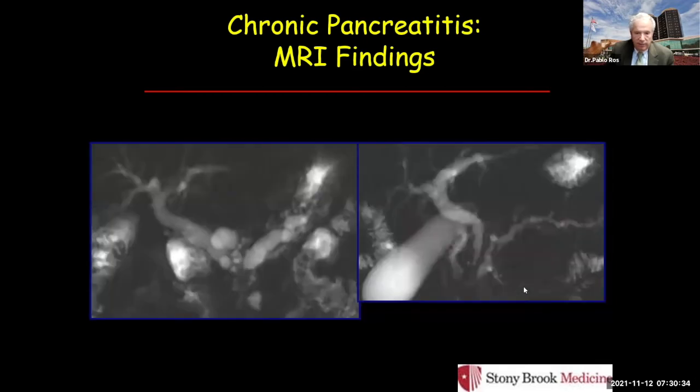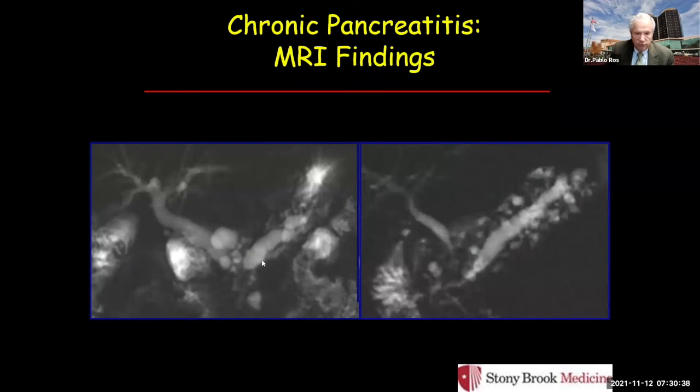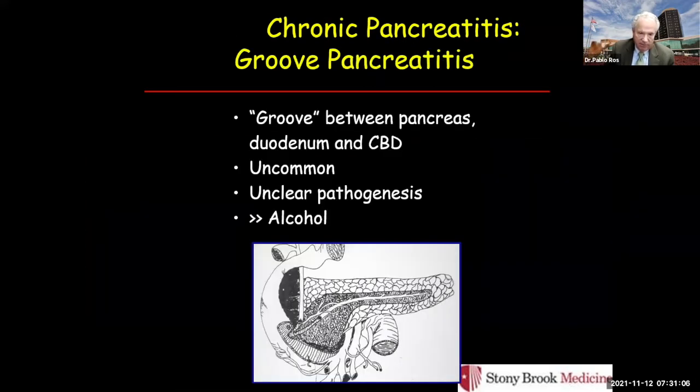And here, obviously, we go from modest to very severe, two different examples of chronic pancreatitis with marked dilatation of the pancreatic duct and these areas that you could consider dilatation of side branches through the entire pancreatic duct, maybe with some tiny pseudocyst formation. Same in here, marked severe dilatation of the common bile duct and common pancreatic duct in patients with chronic pancreatitis.